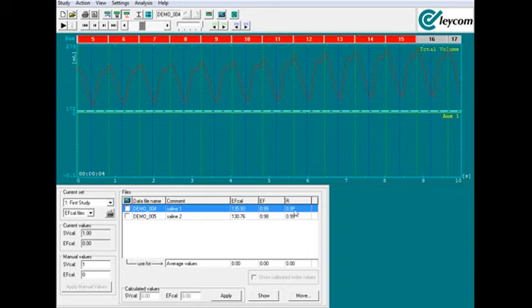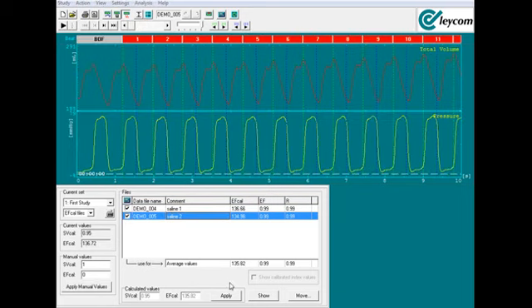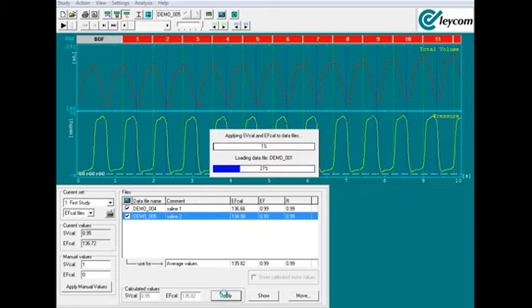Both are 0.99, which is perfection, so we will be able to average the two values here by clicking the check mark of both and updating the average value on the bottom. Before clicking apply to finalize the volume calibration, double check that the SV-cal and EF-cal calculated values have populated with some new number. Recall that these aren't direct measures of stroke volume or ejection fraction and are simply arbitrary numbers used for the volume calibration. I am ready to click apply.